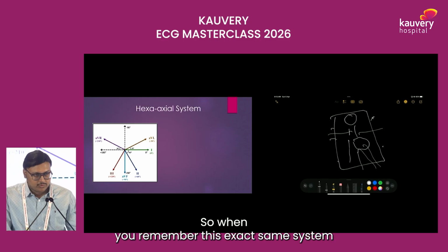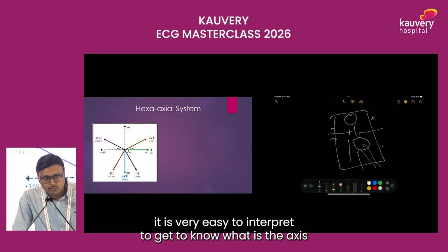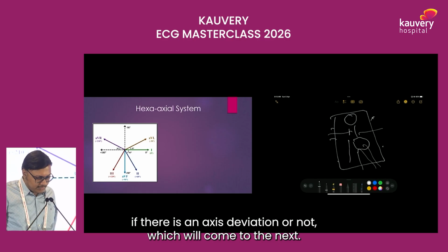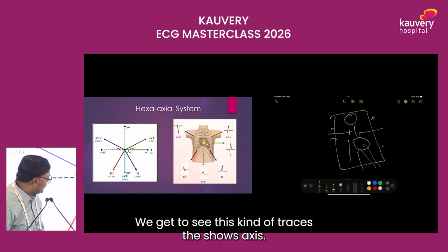So when you remember this hexaaxial system, it is very easy to interpret, to get to know what is the axis, if there is an axis deviation or not, which we will come to next. And once we see this, we record the voltages in the ECG. We get to see this kind of traces, the QRS axis.